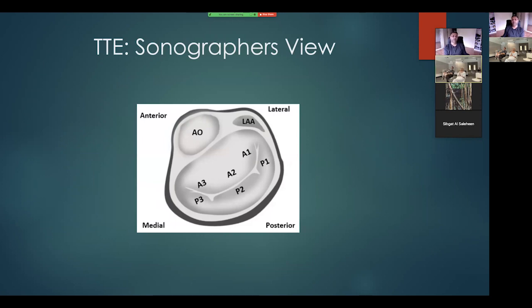If there's no aortic valve, I always look for the right ventricle. And again, right ventricle is anterior structure. So the leaflet, whichever is closer to aortic valve or the right ventricle, that's anterior, and the other one would be posterior.